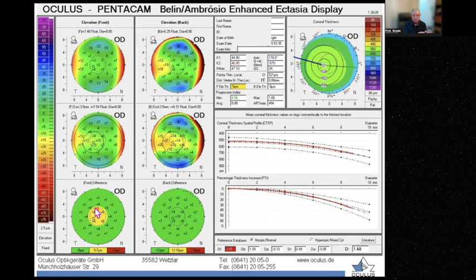So whenever you see such colors, look at the maps on the bottom, because these maps show the difference before and after the modification of the best fit sphere. If you see no complete green, then you have to recheck.